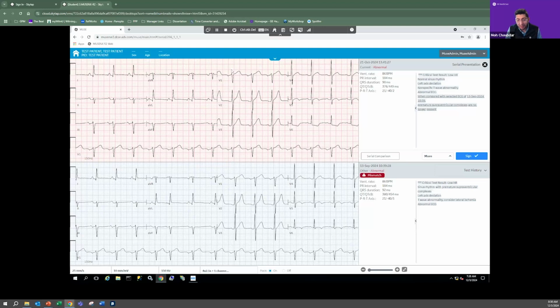So while you guys are answering my question, I have another question that came in. It says, in Germany, we have ECG result reports like SR, HF64, comma, LT, no disturbance of respiration in one line with comma separated. So no text like abnormal ECG. Could you set up a system like this? So you want it to be, when you hit enter, provides the comma? Am I understanding that correctly? So when you're done typing, you hit enter, it puts a comma and goes to the right after the comma and allows you to type again?